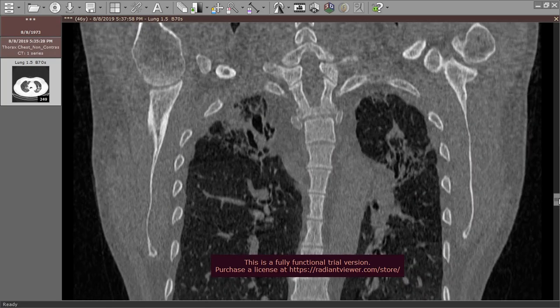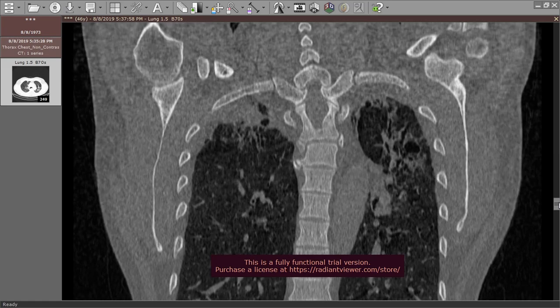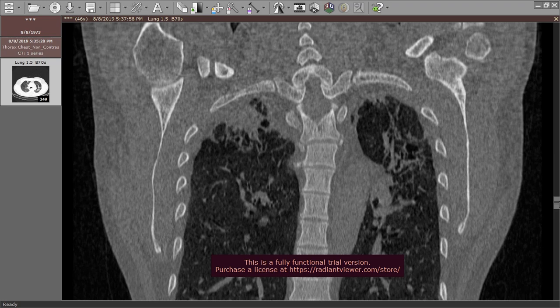Can you rely upon the spiculations here? No, the presence of spiculation is classic because of the fibrosis itself. So, if I have progression in size or direct signs of invasion, I will suspect scar carcinoma and ask for PET-CT or MRI.